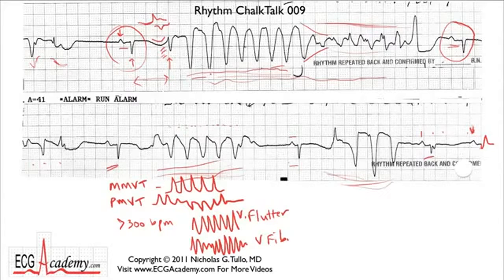You guys who know how to read ECGs should have pulled out your calipers. Let me pull out my trusty calipers and notice that the QT interval of this sinus beat over here in the beginning measures out to be a whopping 700 milliseconds. Oh my goodness. 700 millisecond QT interval. You better not go back to sleep. Let me tell you, something bad's happening here.